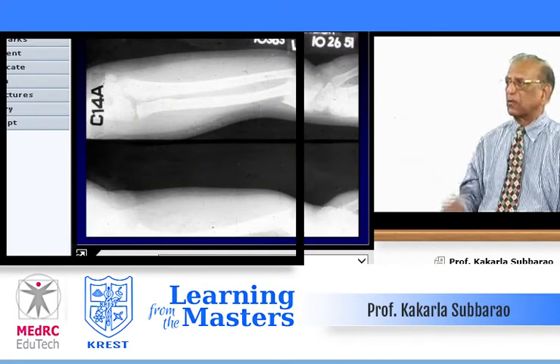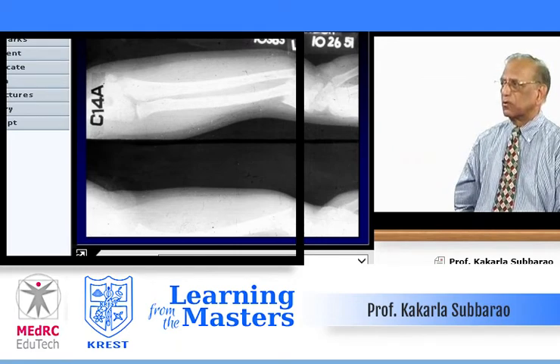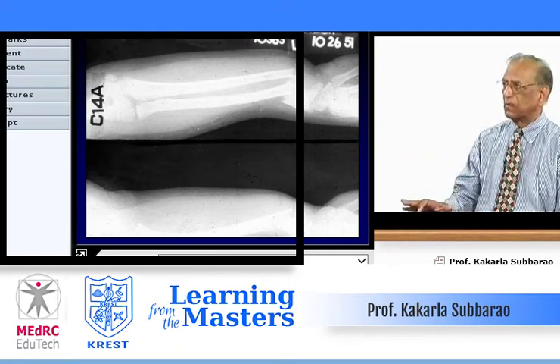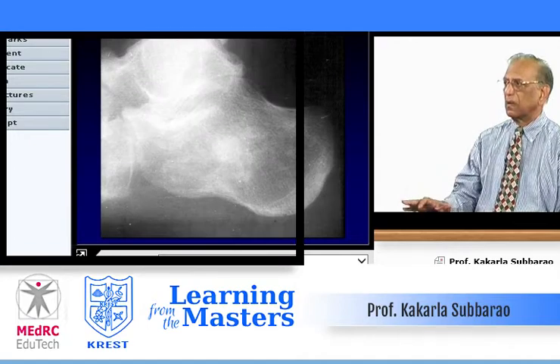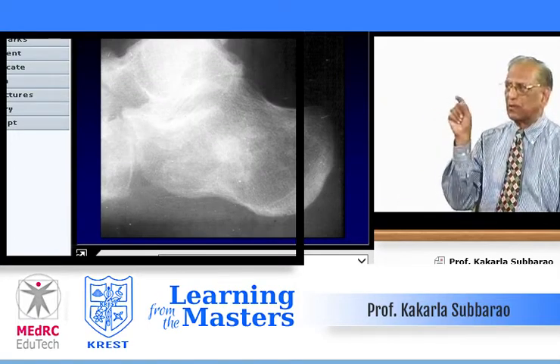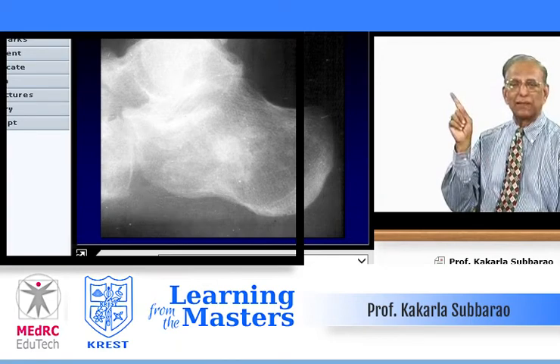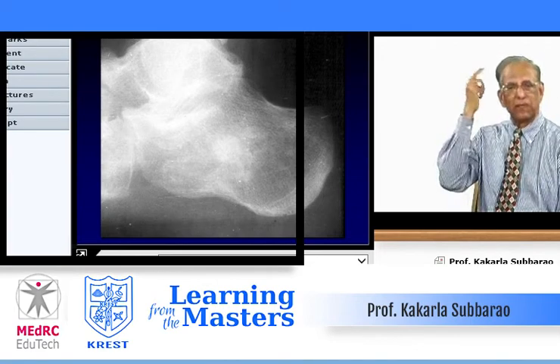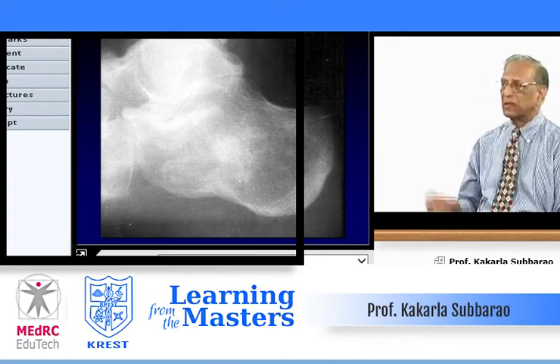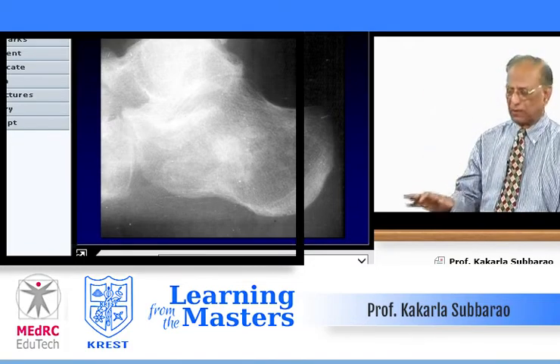Of course, here there is no problem. Fractures of the lower ends of both bones of the forearm. Here, there is a fracture, but it's an impacted fracture. That's why you get a double density in the middle of the calcaneus. Just because there is no translucent line, it doesn't mean there is no fracture. Same thing in the depressed fracture of the skull. When a double density is produced, think of a fracture.